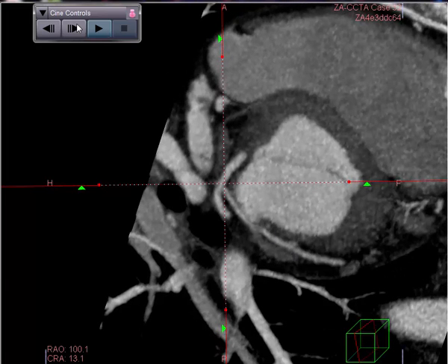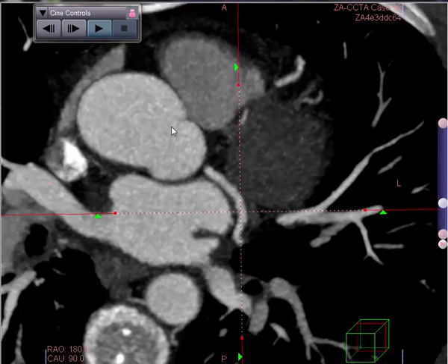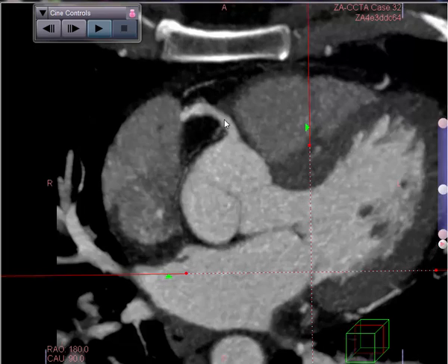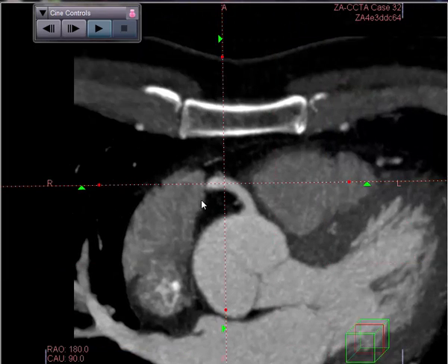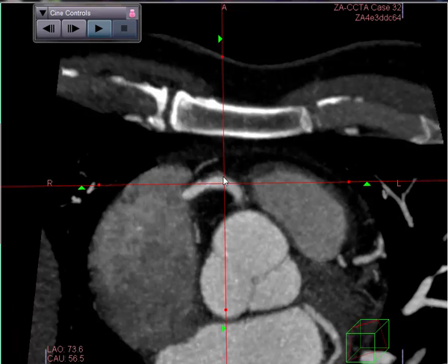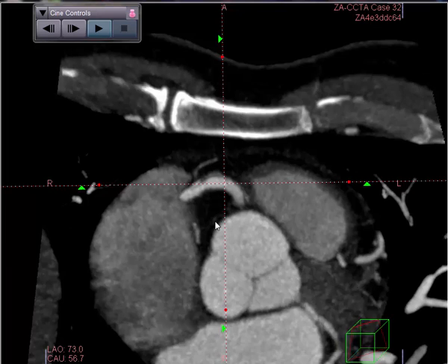Let's look at the right coronary as well. Let's switch to the foot view. Bring this down and concentrate on the RCA. As you can see in the proximal segment, there is some eccentric plaque here. This is difficult to characterize. Let's see if another phase will be helpful. This is possibly an ulcerated area with some non-calcified plaque, but clearly non-obstructive.